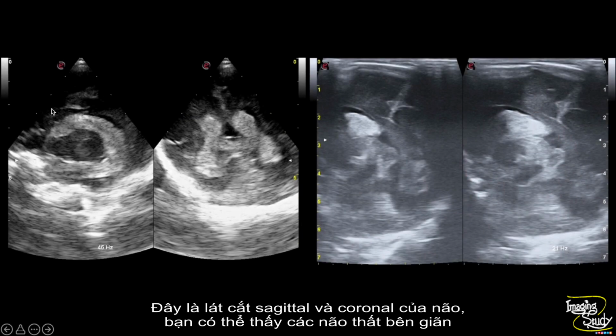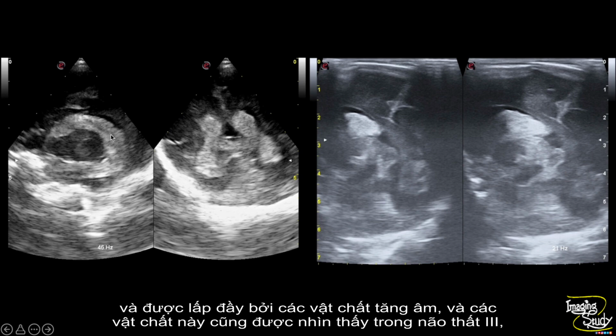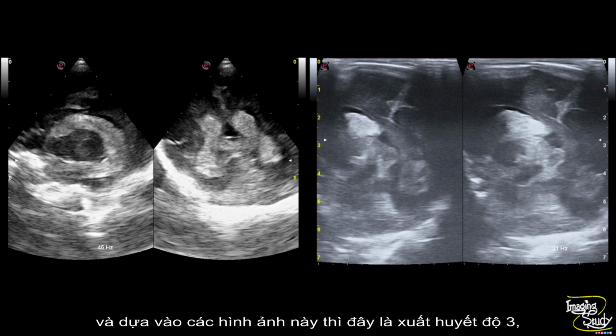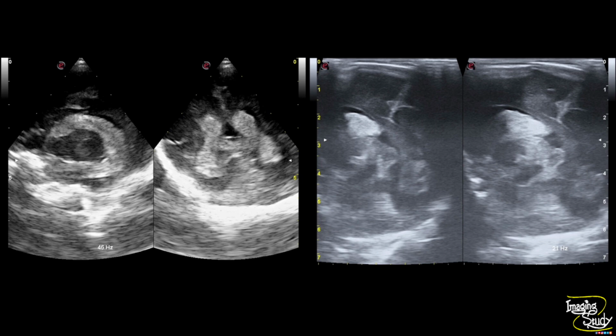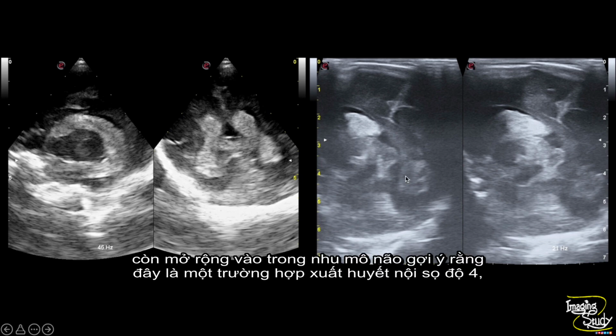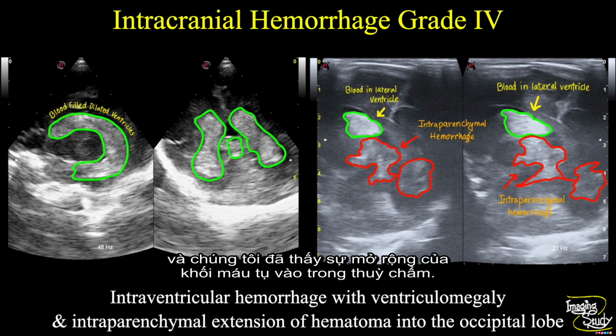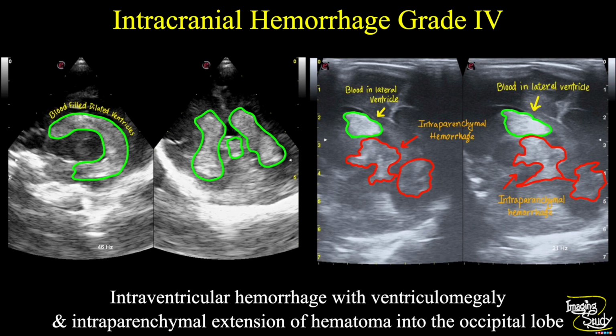This is the sagittal and coronal section of the brain where you can see the ventricles are dilated. You can see the ventricles are filled with echogenic matter, which is also present in the third ventricle. So up to this image, this is a grade 3 hemorrhage, but on the right one, you can see these echogenic foci are also seen extending to the brain parenchyma, indicating a case of intracranial hemorrhage grade 4, where we have found the extension of the hematoma into the occipital lobe.